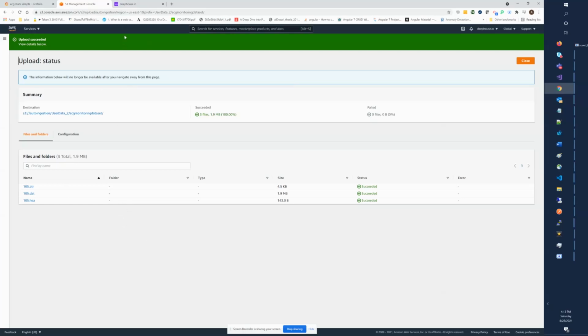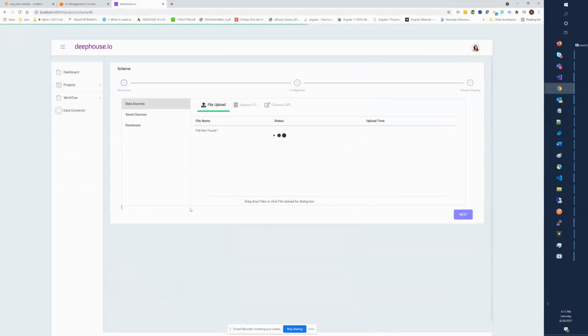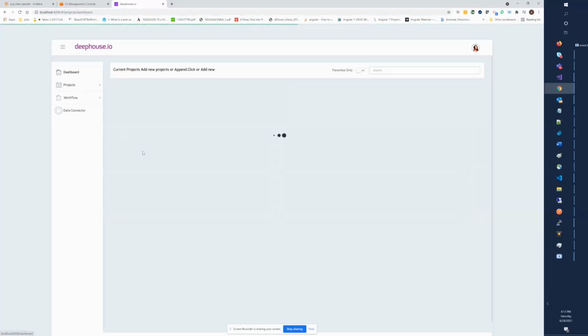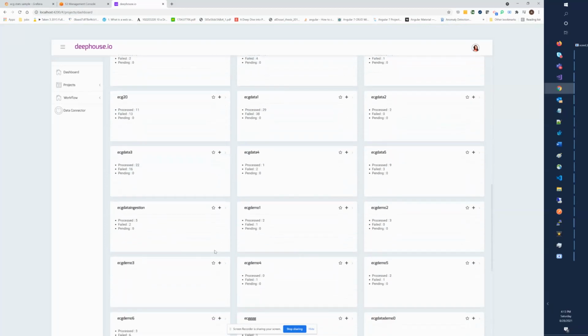Now let's see if this was uploaded to our project, to see if the 105 was uploaded. Give it a minute to get to that data.